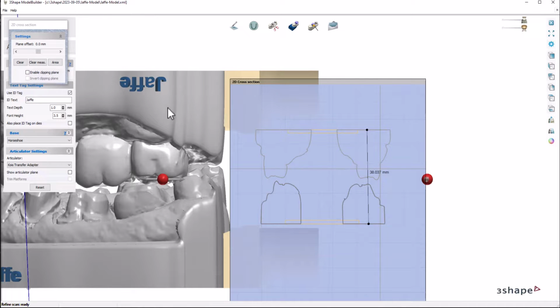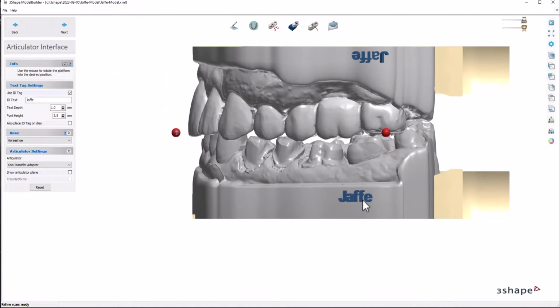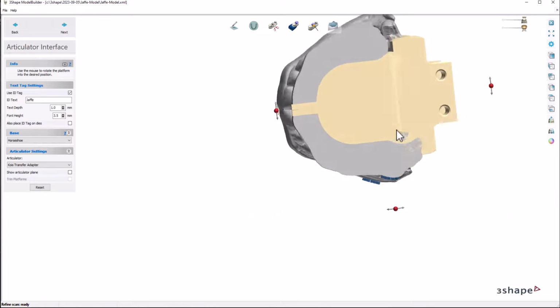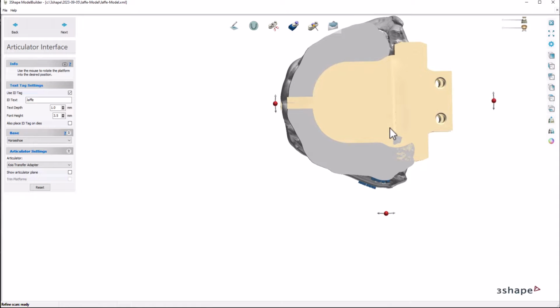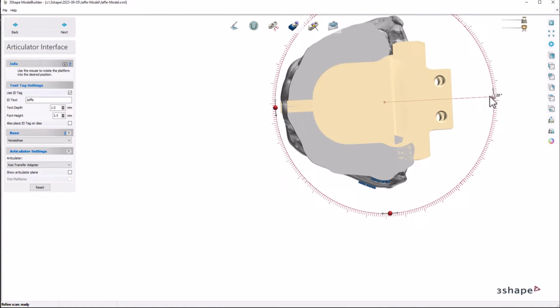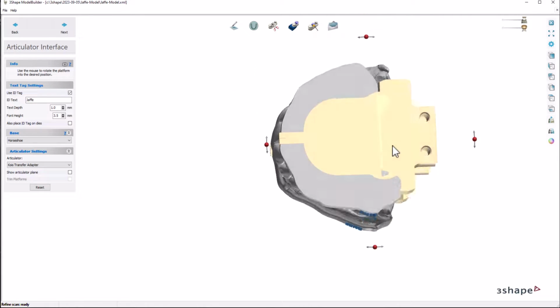We know our model is not violating the 38 millimeter height, and we will go ahead and leave that there. Now, we're going to put our name up a little bit and make sure our articulator is level with the center, because we do not mount our models sideways. That's probably good right there.